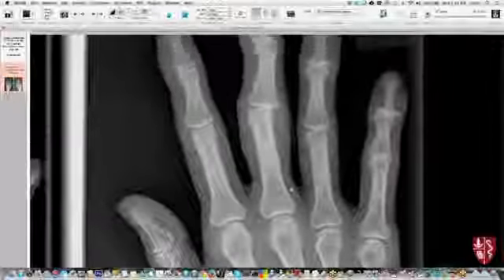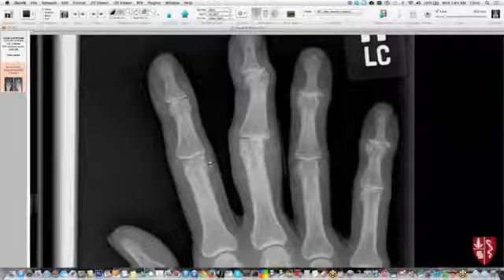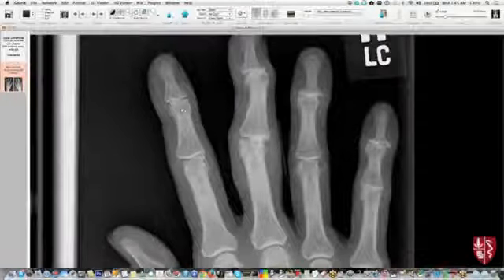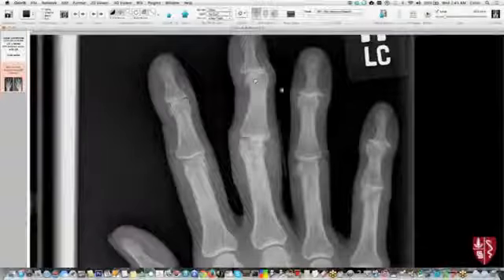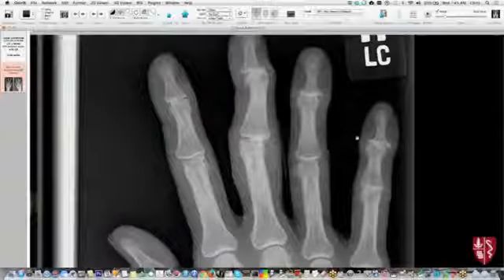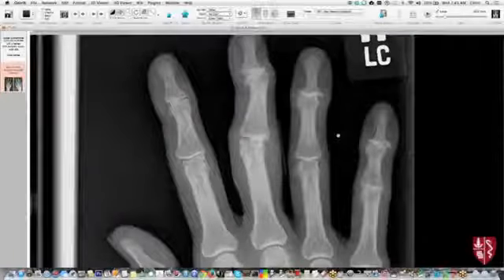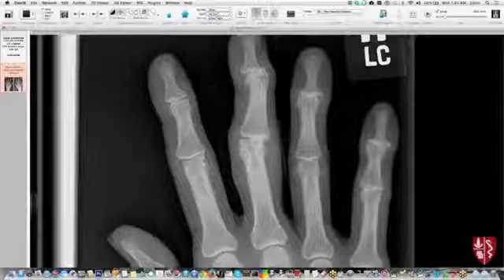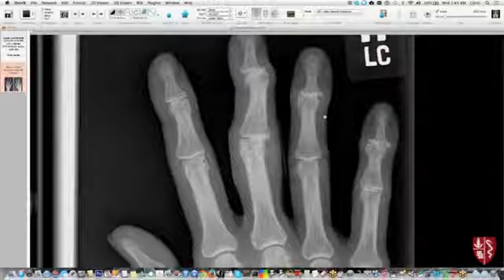As you go more distally, you start to see some abnormalities, right? So this second digit is fairly normal here. This DIP joint starts to show some narrowing, small osteophytes. And these are more advanced here and here. And so we should know that when you're looking at arthritis, if it's more distal involvement without erosions, like in this, that's a pretty classic appearance for just osteoarthritis involving the hand.